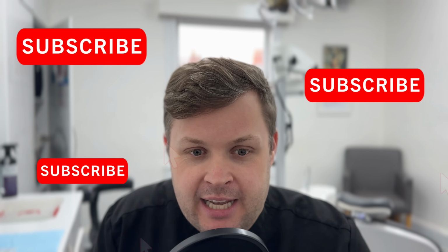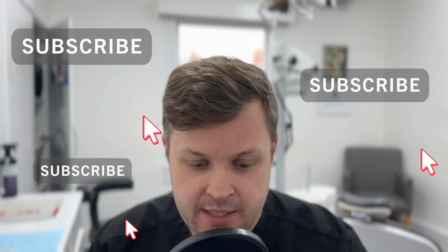I've chosen this clinical case this week because there's been a bit of a conversation between me and another endodontist about obturations that might look long or might look short. It transpires that this case came up this week. Although the obturation looks quite short, I think personally that this is to length.